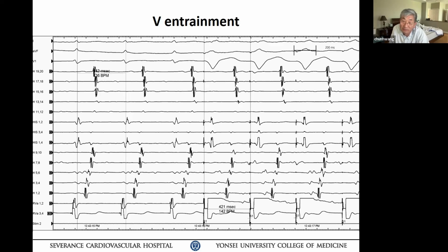Is it not the same? So that one is different from the first 2, and slightly shorter. This should give you a clue already. Okay? So there's much evidence here that the patient probably has a double tachycardia. You just have to find the answer.